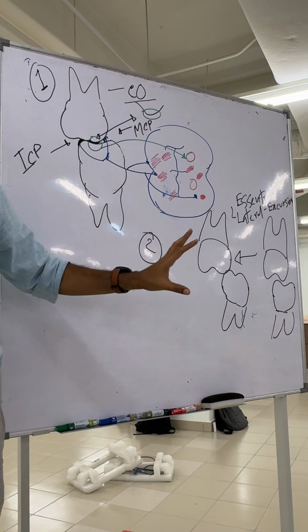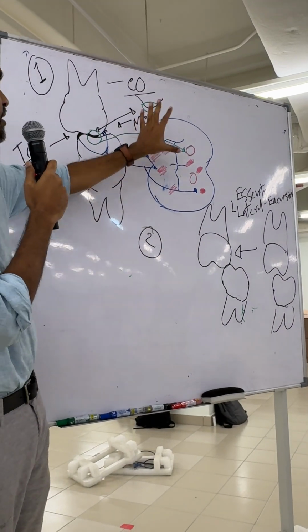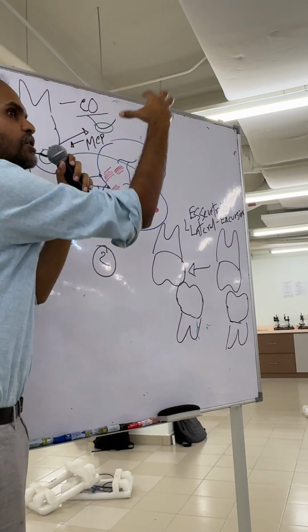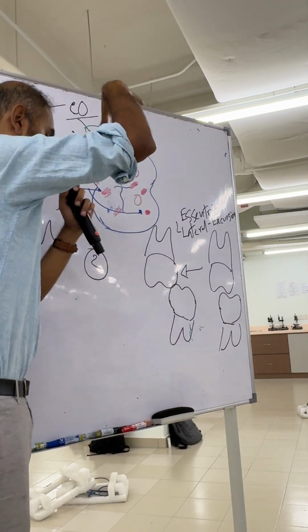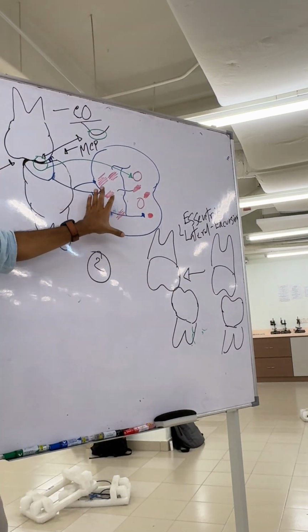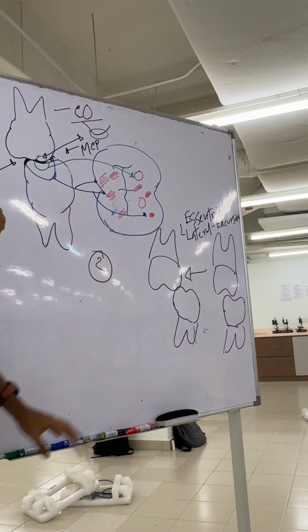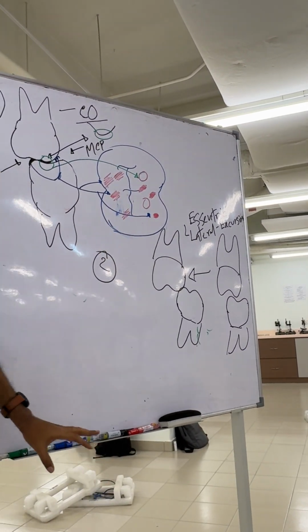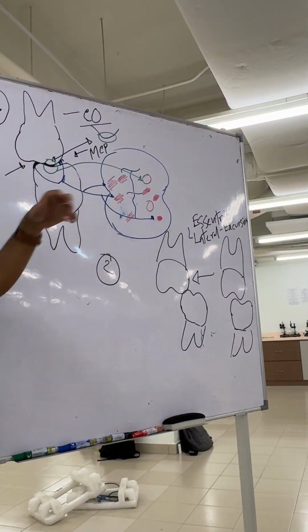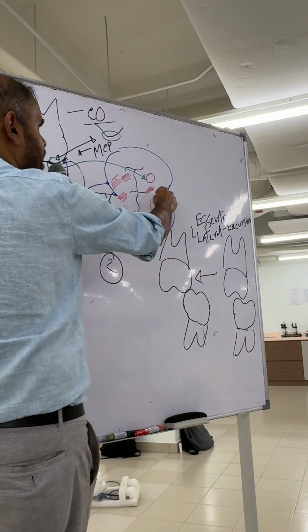Okay, now we start seeing the teeth occlusal table. This is the occlusal table from the top view. So we could be seeing a scenario like that. In this scenario, you will see that some red colored dots are being created here, right? One looks very nice, rounded.